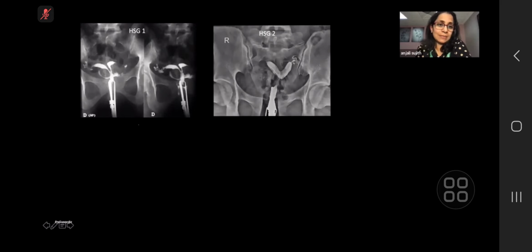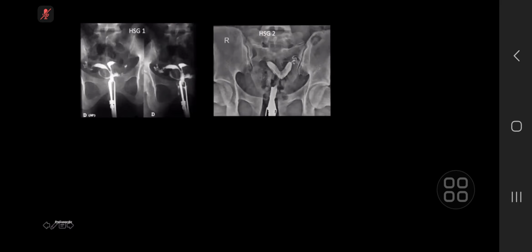So yeah, the two separate hysterosalpingograms. Describe the first one. The first hysterosalpingogram has a single cervical canal and then two separate normal morphology uterine cavities that are completely separate and have normal spill into the fallopian tube. There is an impression of communicating rudimentary horns to the right and left, although by the nature of a dynamic study, I would want to exclude that it wasn't spill that was then collecting in the pouch of Douglas.